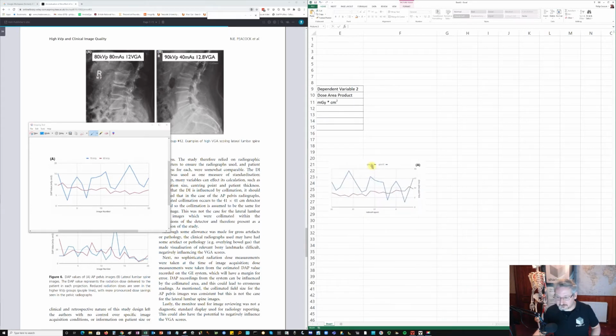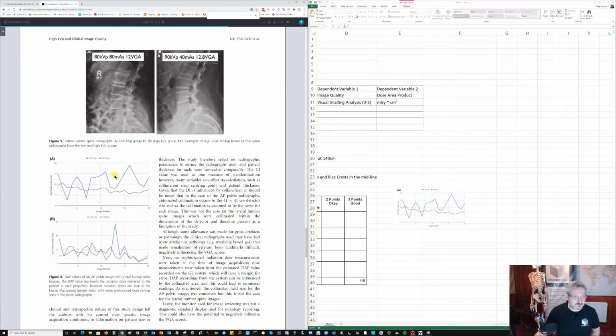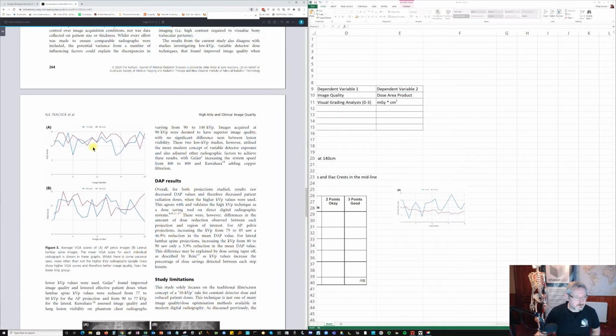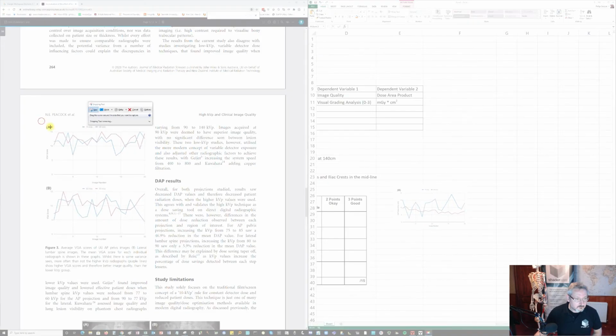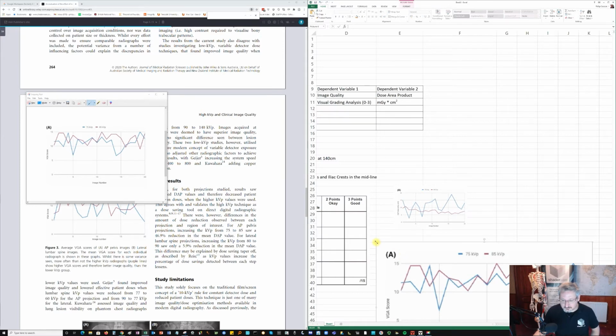Oh, I've reversed it there. Don't want to do that. And this is just a reminder for me, mental note, these are the things we're going to need to report. And VGA. So just make that smaller as well.